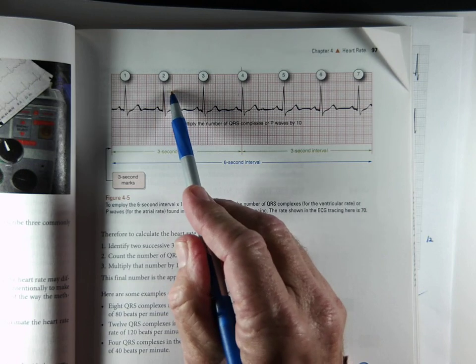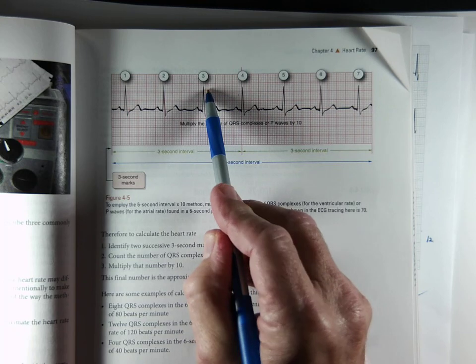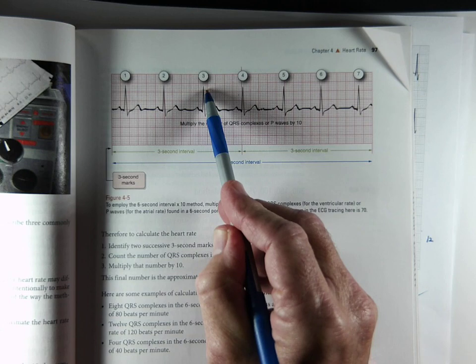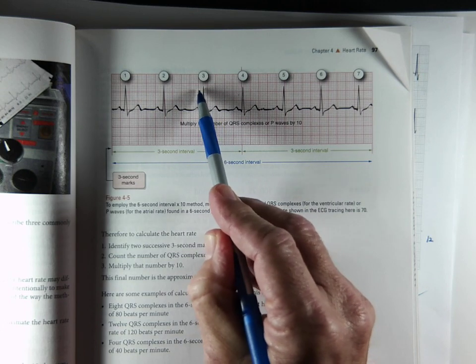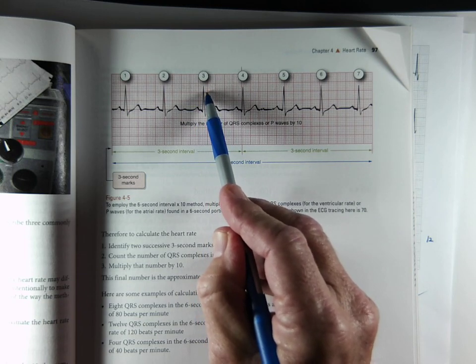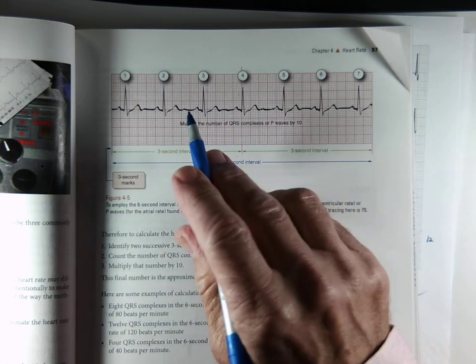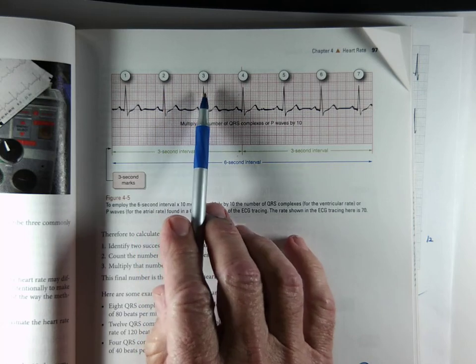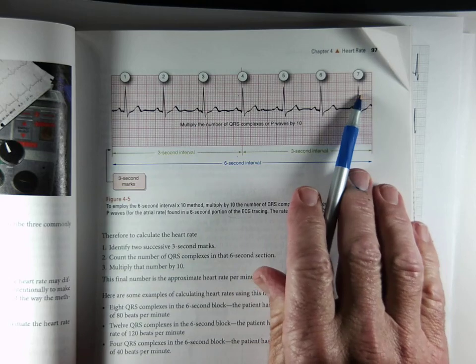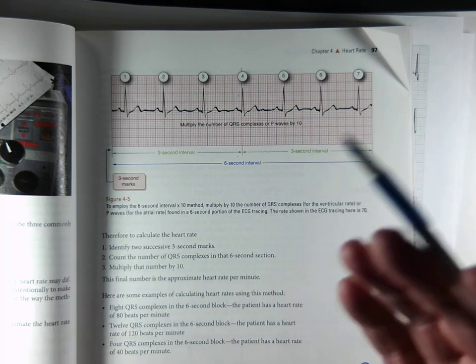take 300, 150, 100, 75, and 60, and between 75 and 60, they're each a 3. There's 5 boxes. There's 15 total difference between 60 and 75. So each box is 3. So if this is 60, 63, 66. Okay, so we'd have 66 versus the other technique, which was 1, 2, 3, 4, 5, 6, 7 times 10, was 70. But once again, if this was off the paper a little or we'd started a little sooner, we could be 60. So 66, 70, we're pretty close.